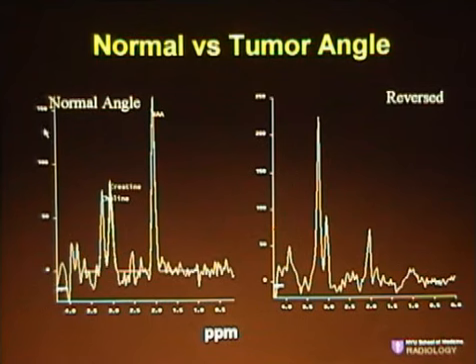The vertical axis, and some of the manufacturers may have no units whatsoever on the vertical axis. On the Siemens scanners, you will see a number here, but there is no unit. And I tend to use the numbers sometimes to demonstrate ratios or to calculate ratios, but remembering there's actually no unit on the vertical axis.